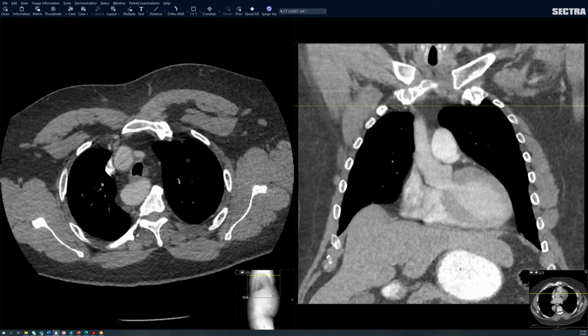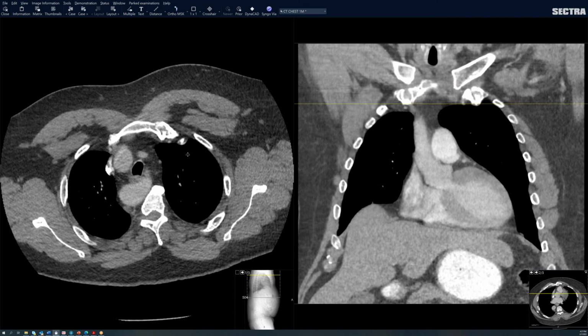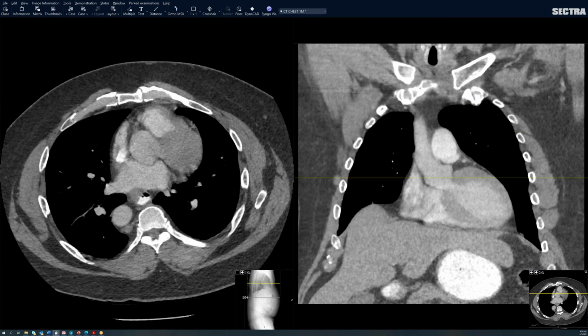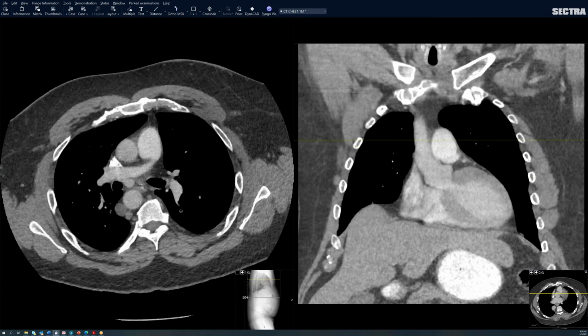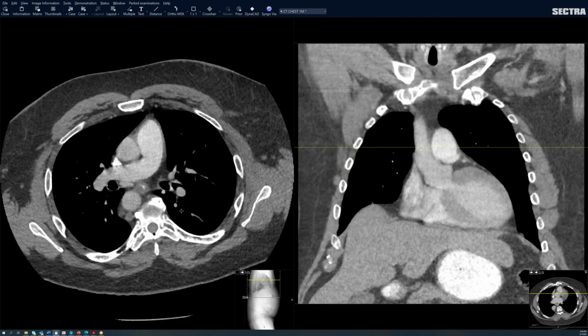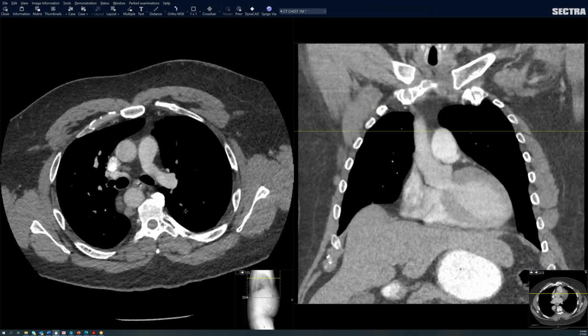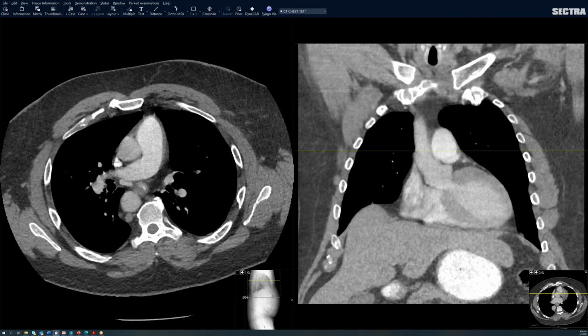So here we are looking at the right and left pulmonary arteries, and let me think if you see anything that's unusual or something that we don't routinely see, regarding the orientation and the way the pulmonary arteries arise. So any thoughts about this?